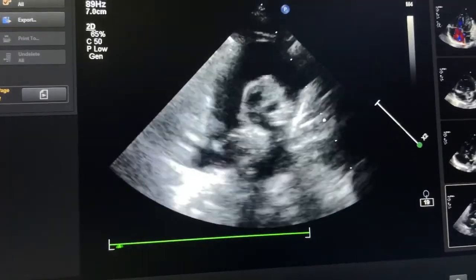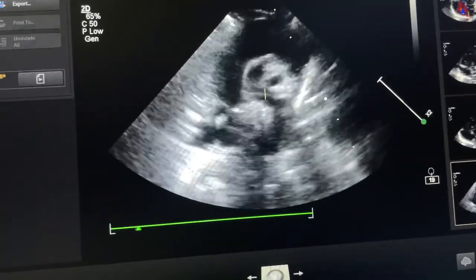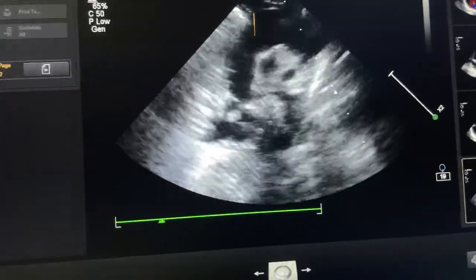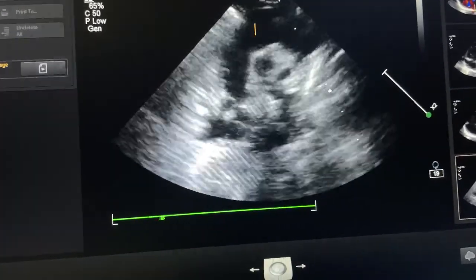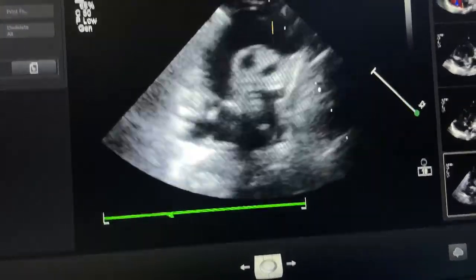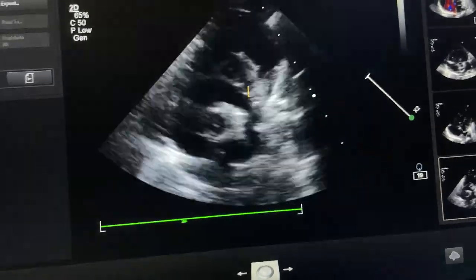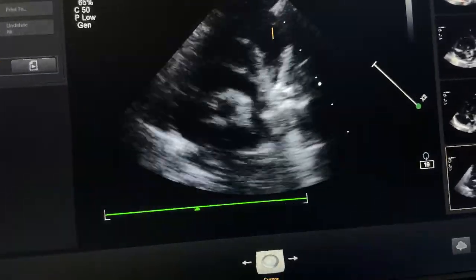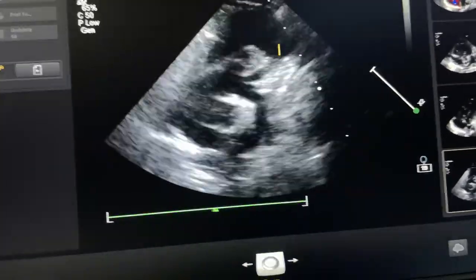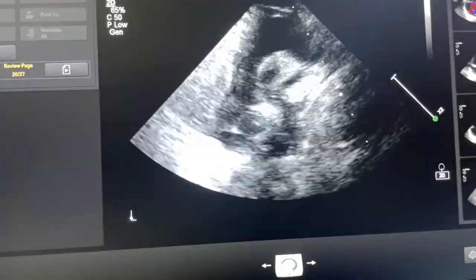Whenever you find two arcs, you see here this arch of aorta, and just superior to the arch of aorta, that is total anomalous pulmonary venous connection, and this is the left innominate vein that is dilated. So arch above arch, that is total anomalous pulmonary venous connection. You can easily see this image. Next image.